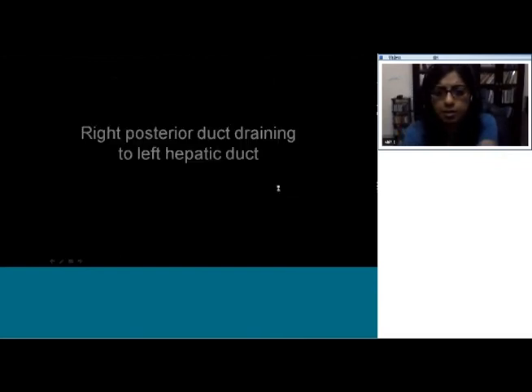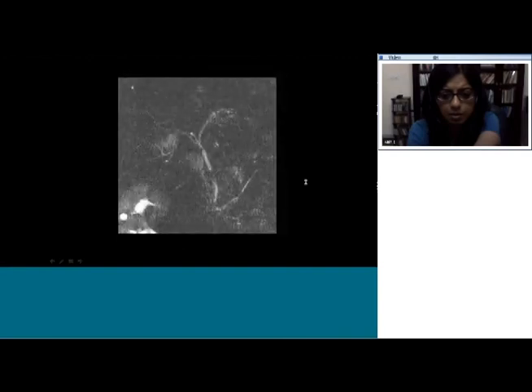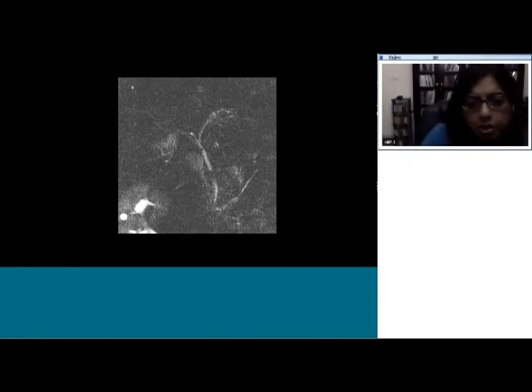Okay. I'm going to show you a couple of pictures. Tell me what you think of these. This particular case. No impression of the cystic duct. Actually, this is a better picture. Trifurcation. That is right. That is trifurcation. Yes. The same thing here. Trifurcation.